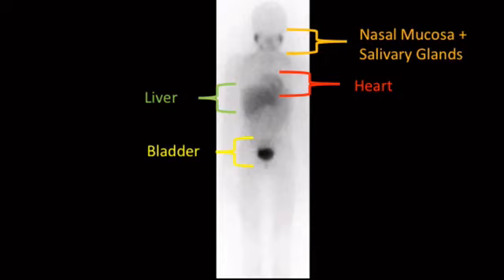Now, morphologically, you may see a normal adrenal on SPECT. Morphologically, normal should look like a Y or V. But even then, on SPECT, it's usually very faintly seen, like 30% of the time with 123, and even more rarely with 131, because remember 131 has less photon flux because you can't give as much dose.